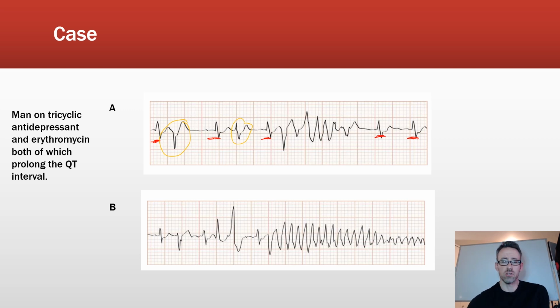And you'll notice right about here, after his normal, on his third beat in the middle of his T wave, he ends up with another PVC. The PVC fell on the T wave. And so what you're seeing is a short run of VTAC. So you got a little run of VTAC, but then he kind of came out of it.